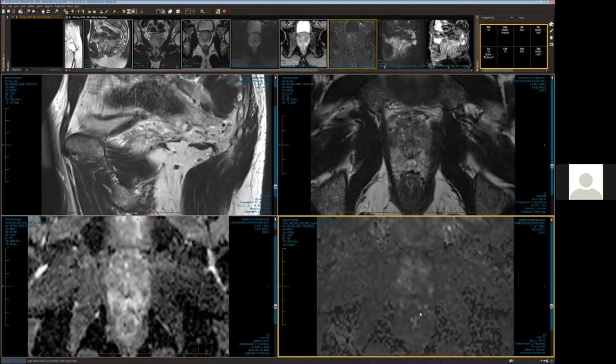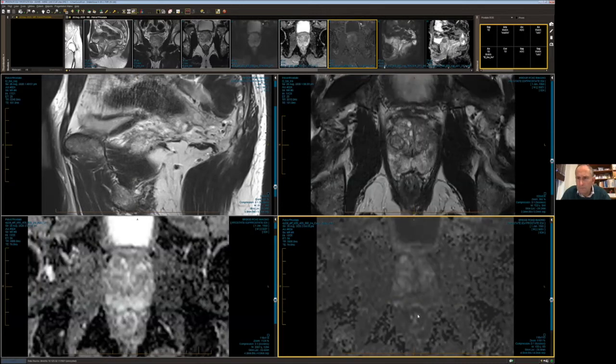Okay. Happy? Lisa? In any case, I confirm PIRADS 4 on the left apex. Yes, here. And I suggest also to biopsy at the level of the BPH nodule. My suggestion is PIRADS 3, no more, and the stromal BPH. Yes, I think that's what you did, isn't it, Jeremy? Yep, we'll come to that in just a moment.